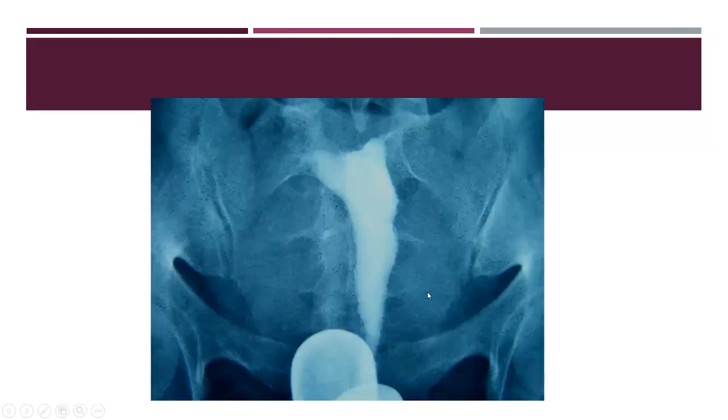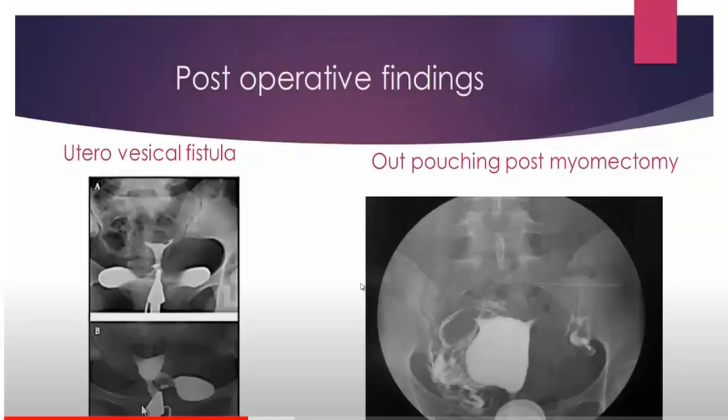Again, a large fibroid uterus, large cavity with extrinsic indentations. Usually think of fibroid. And it is common with infertility.